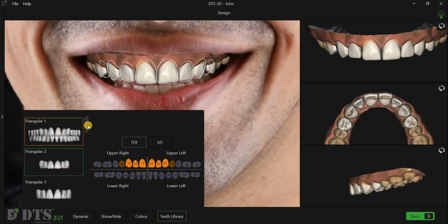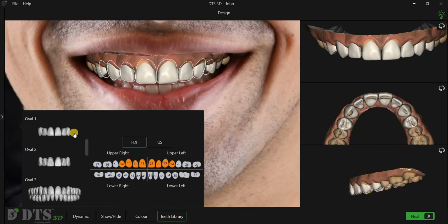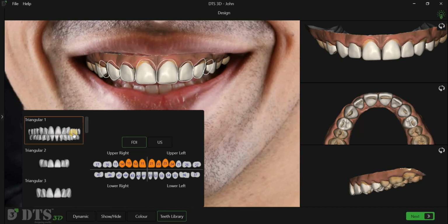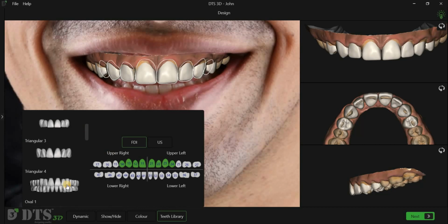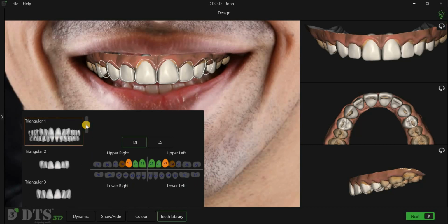Interpreting the color coding of shells. The total number of highlighted teeth represents the number of added shells. If the shells turn green upon clicking on a library, it signifies that those specific shells belong to the selected library. Meanwhile, the remaining shells are orange, indicating they belong to a different library, which is highlighted in orange.